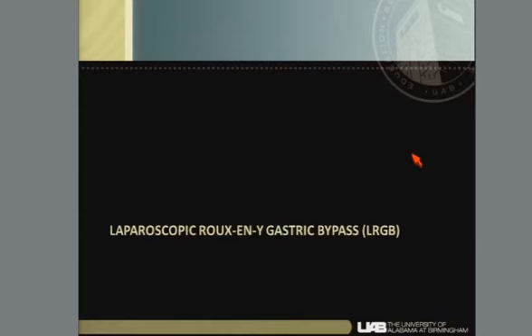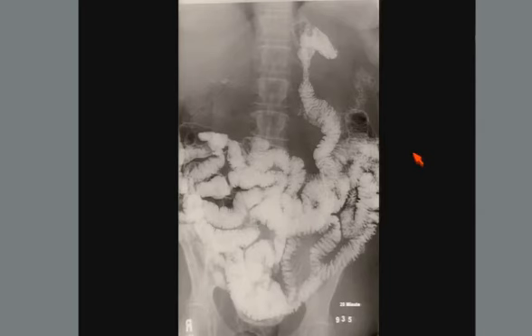So let's move on to a little bit of bariatric surgery, and we'll start with the Roux-en-Y gastric bypass. These patients have a roughly 1 to 2 ounce pouch that is created from the stomach, the gastric cardia specifically. They have a blind roux limb here, and then the roux limb extends into the abdomen. Now, the places that we need to look for leak are here.